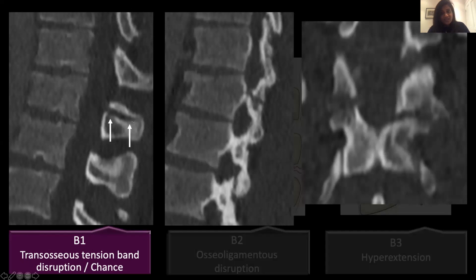So here we can see that fracture of that spinous process, which is going along in this horizontal line. You can see that corridor of injury, and you can see also that they have a fracture of that vertebral body with that anterior superior corner fracture as well. And here you can see on the coronal imaging, the fractures are orientated in that horizontal plane.